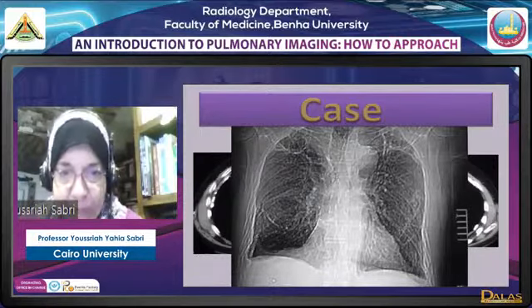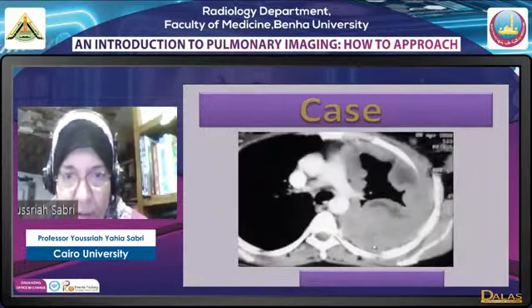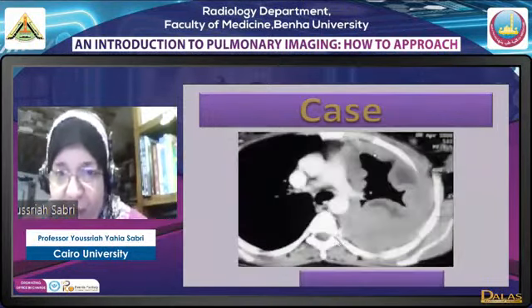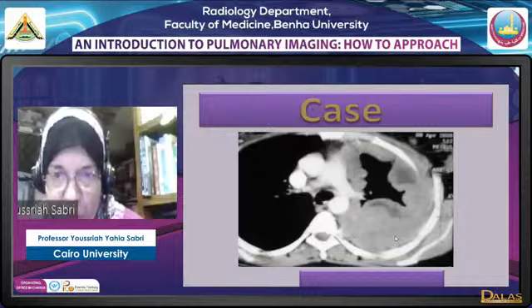Now here we have circumferential nodular thickening on top of an asbestos exposure. This will suggest that we may have a mesothelioma. Here on the other hand, we have the typical appearance for a radiologist of a mesothelioma, which is circumferential nodular thickening of the pleura.